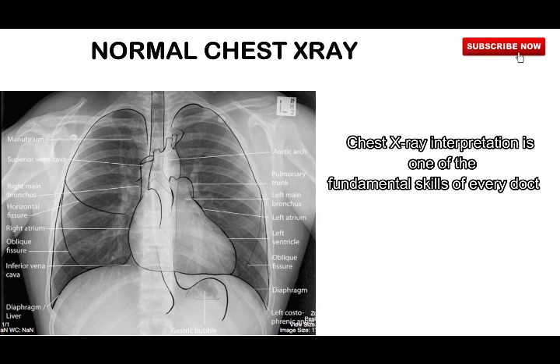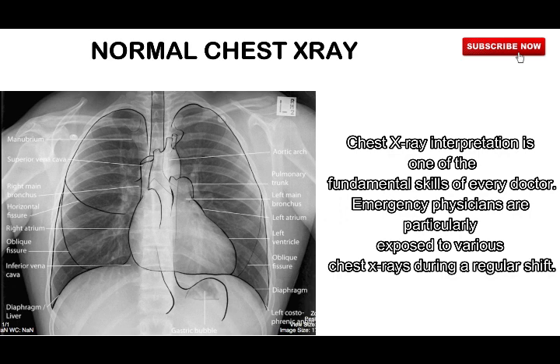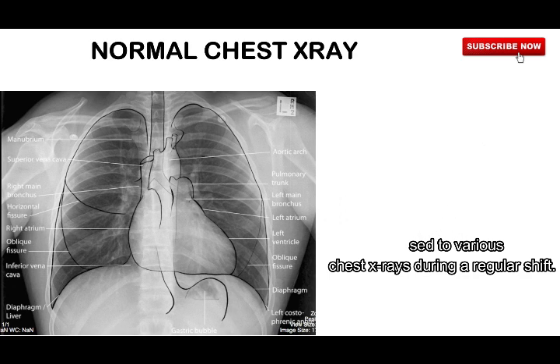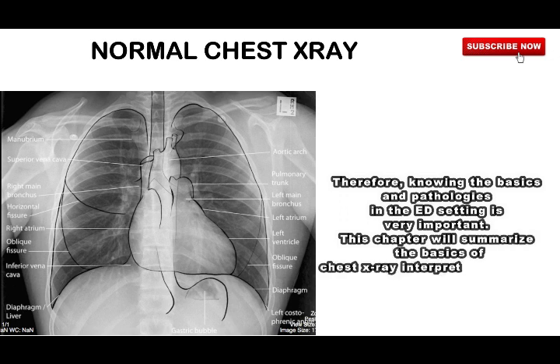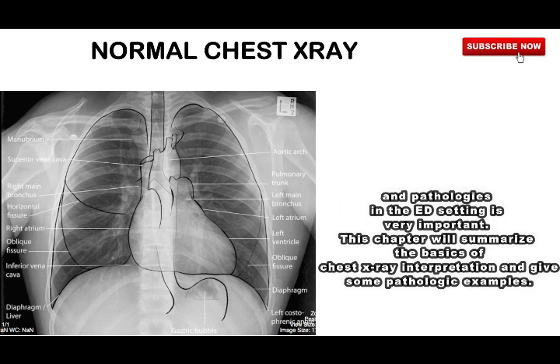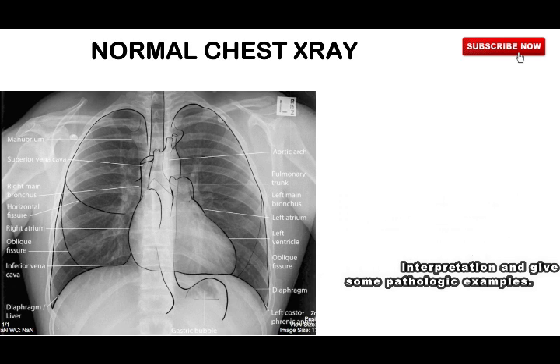Chest X-ray interpretation is one of the fundamental skills of every doctor. Emergency physicians are particularly exposed to various chest X-rays during a regular shift. Therefore, knowing the basics and pathologies in the ED setting is very important. This chapter will summarize the basics of chest X-ray interpretation and give some pathologic examples.